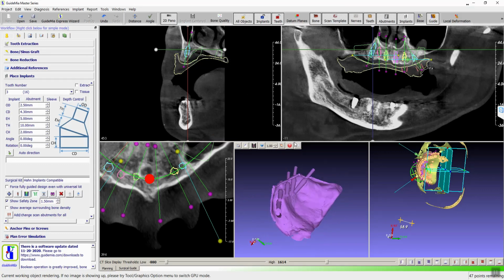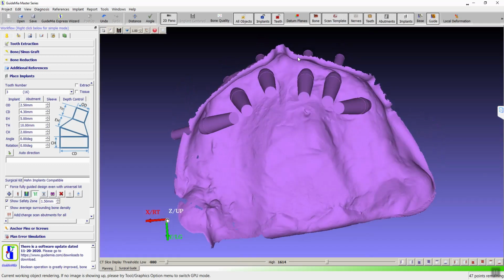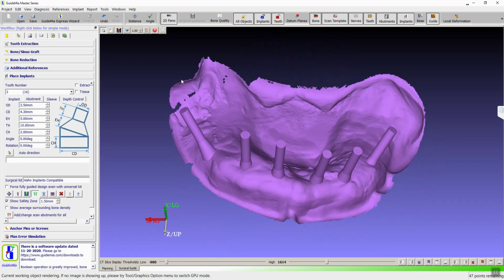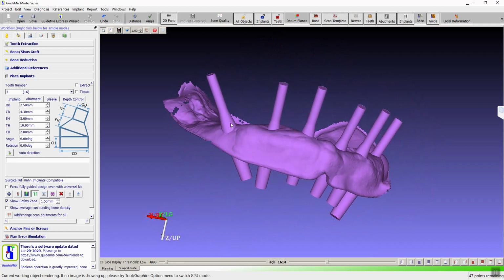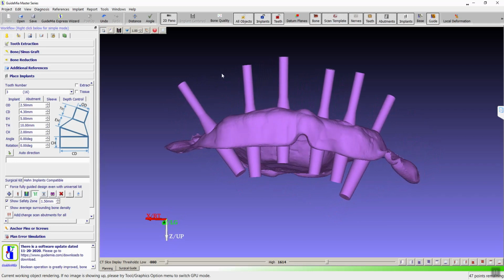We put them into one single file. Again, if you want to, we can export into different files, but this is what we have now, altogether. If that was the scan bodies, you should be able to pull that right into 3Shape, right? Yes. If this is a scan body, you can just put it into 3Shape or exocad and do your stuff for customized abutment design or restorations, etc.